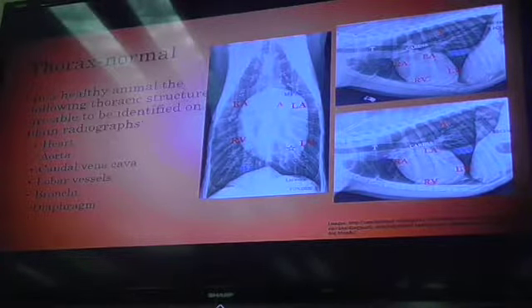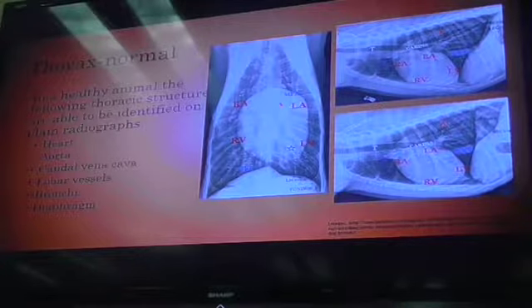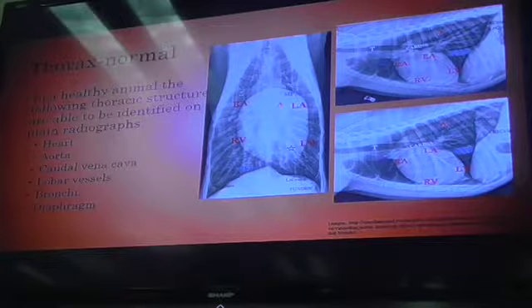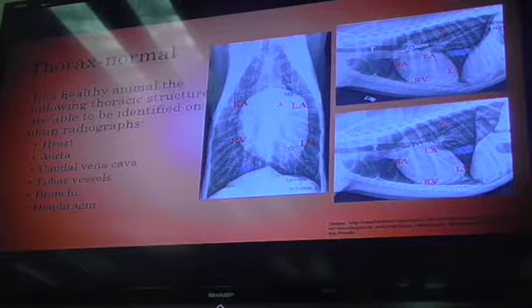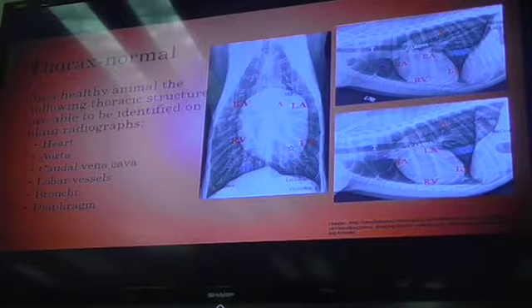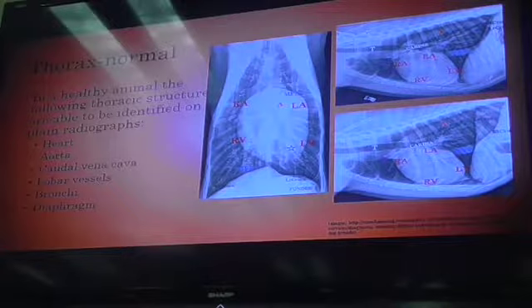Okay? Remember we talk about landmarks when we're dealing with radiographs. You want to look for some of your known landmarks, the things that aren't going to necessarily be moved or displaced by anything abnormal per se. Or if we know they normally sit in a particular area, that when anything is displaced, we can correlate it to what's being abnormal in that area. So some of our stationary things like the vertebra, the ribs, the intercostal spaces, the sternebrae, even the diaphragm, okay? We always look at those in correlation. It's something to compare to.